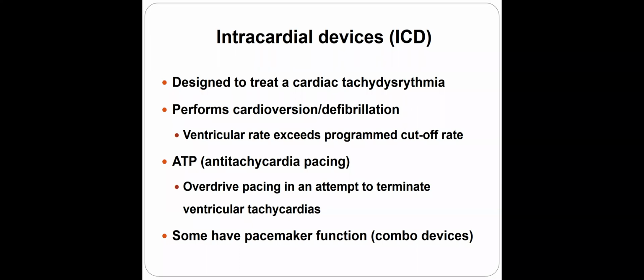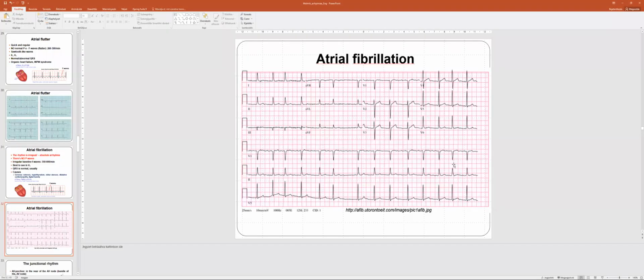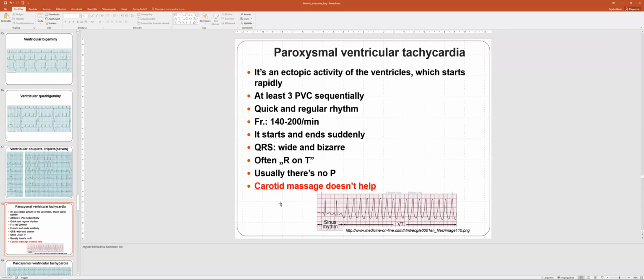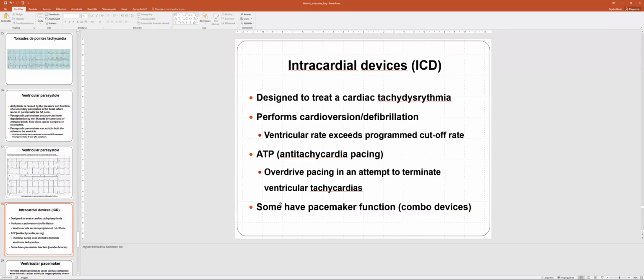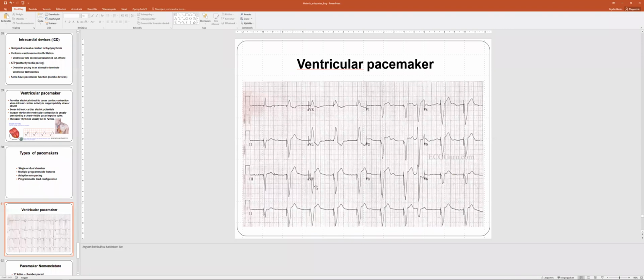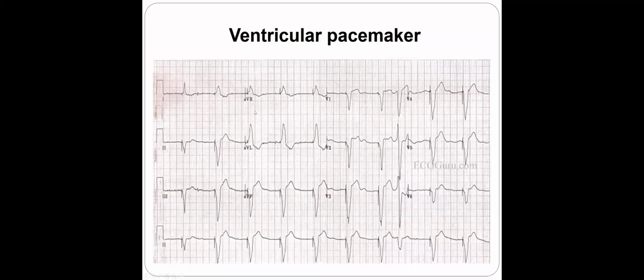Okay. I'm not going to talk about this ICD or units. If you watch the videos, you can see it. Only one thing that I'm going to mention about this impulse or extra pacemakers: when we do have a little teeny tiny trigger in front of the QRS complex, that's a ventricular pacemaker. If you do have these spikes at the beginning of the P wave, that's an atrial pacemaker.